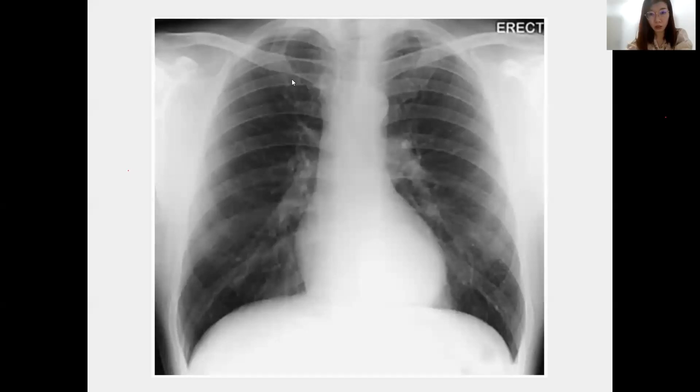Okay, so I need some of you to answer this X-ray. Please put your answer in the chat box. Anyone? Wait, give them some time. Anyone still following, already 10:00? Everybody is here, even Facebook also. Somebody asked a question, but we want to know what is wrong with this. We will answer your question later.